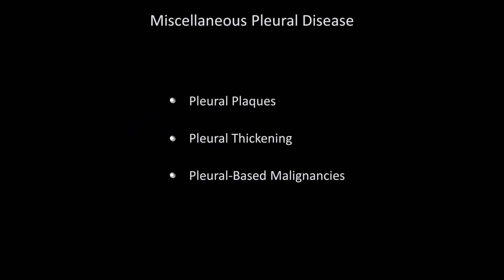Let me move on to some miscellaneous forms of pleural disease. This includes pleural plaques, pleural thickening, and pleural-based malignancies.